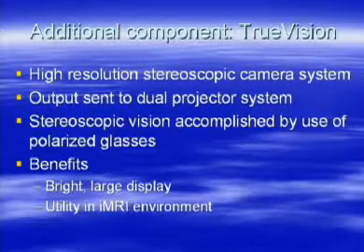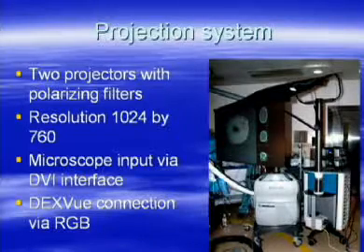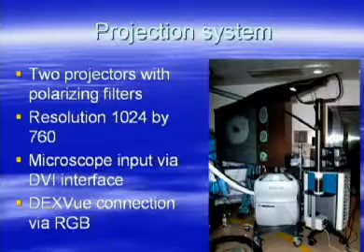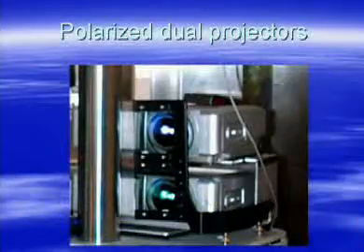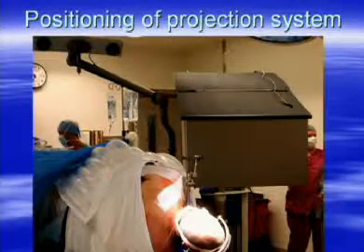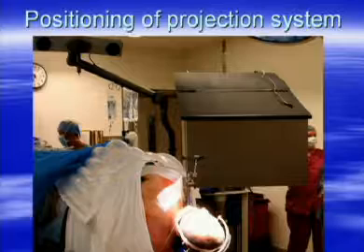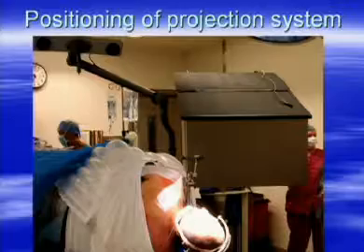The display component was particularly interesting in that it was a high-resolution dual projector system. The two projectors were equipped with polarizing filters. The resolution was downsampled a little bit, and the microscope input to the projection system was accomplished to a DVI interface, and the DexView connection was accomplished by RGB connection. And this is actually the dual projectors in the operating room with the polarizing filters. Now, I'll be the first to admit that this device is somewhat large. However, this would be seen as version 1.0 of this technology.